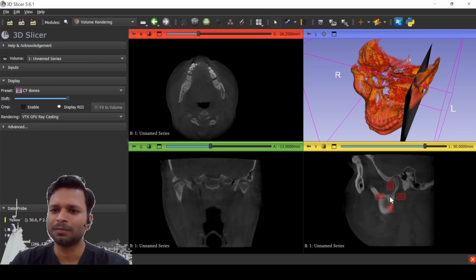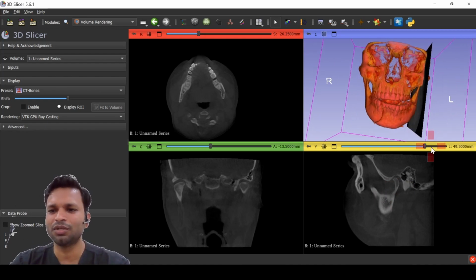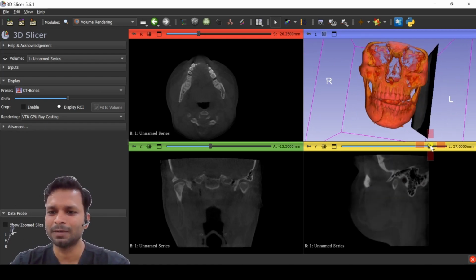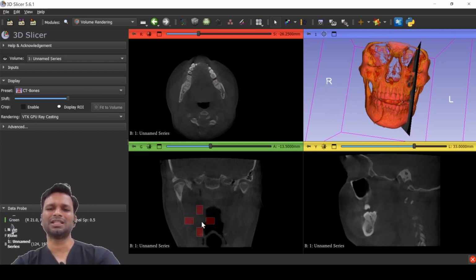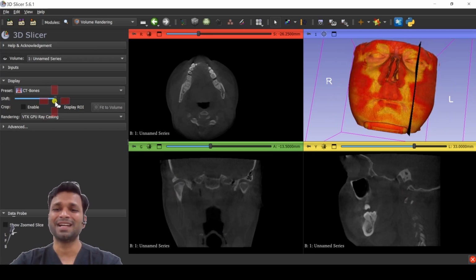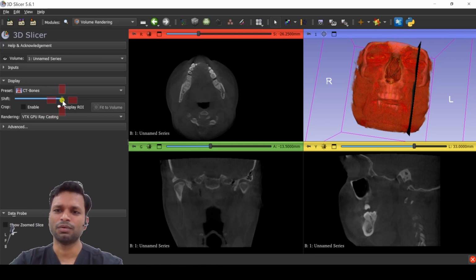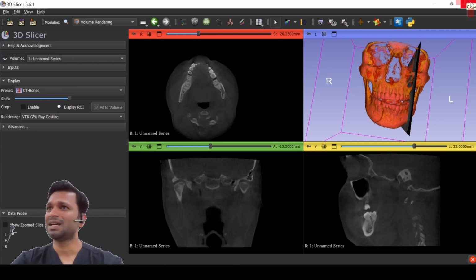So this was your sagittal section. If you know the anatomy of the region, you can easily navigate the area. I'm not going to go into the details, it's already 9 o'clock. So these were the 3 basic slices, that is the axial, coronal and sagittal slices. And we can of course generate a 3D view from the axial slices, and we can decide हमें क्या देखना है. Do we want to watch the soft tissue or we want to see only the bone? Okay, इतना समझ आया conventional CT scan.